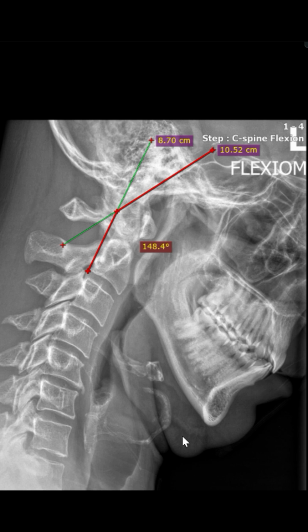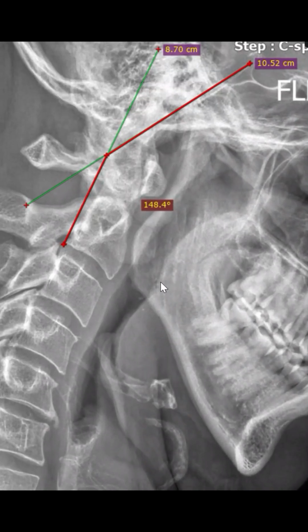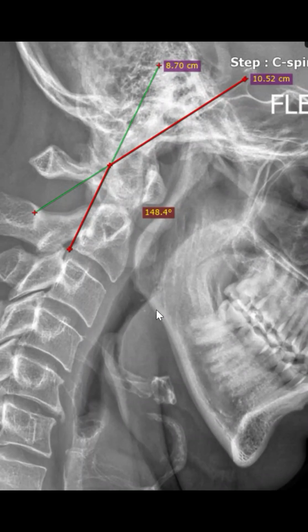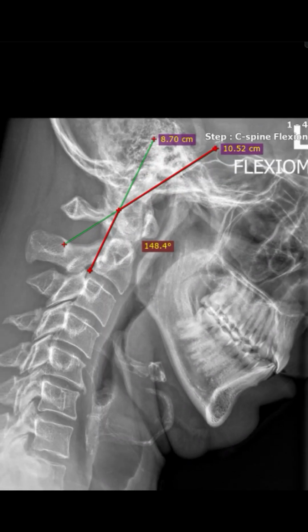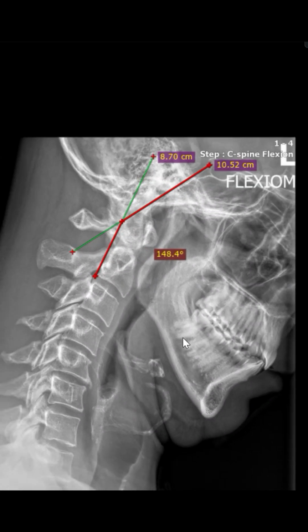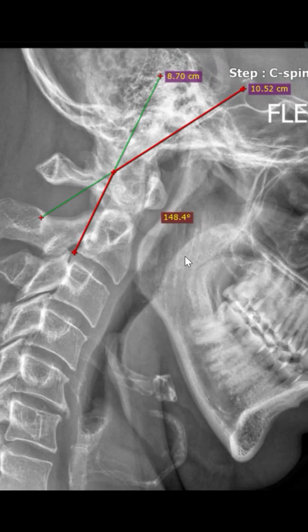normal. And obviously, you can see that the patient's not instructed to look down. They're doing it with just the chin, not with the chin to chest. They're doing more of a chin tuck looking down. So unfortunately, you also have to look at were they doing it the right way. So the tech did not guide the patient the proper way. So it can be done with that.